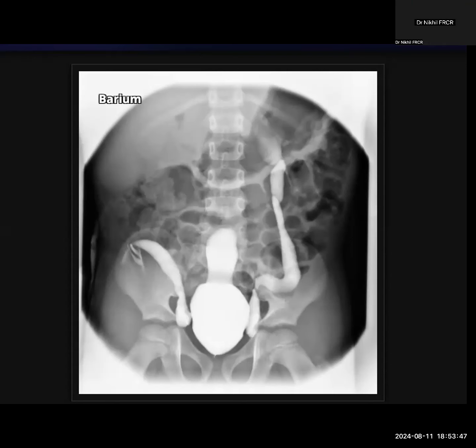Okay. So what do you think? How were you describing something about this, right? What are your differentials at this point? What are you thinking about? This could be a urachus, persistent urachus. The other possibility would be a diverticular outpouching from the bladder, bladder dome.